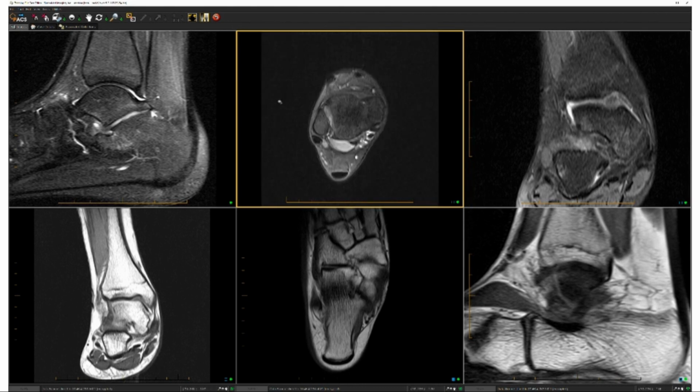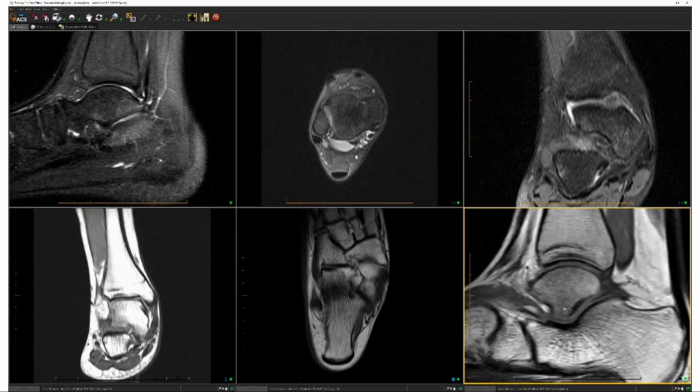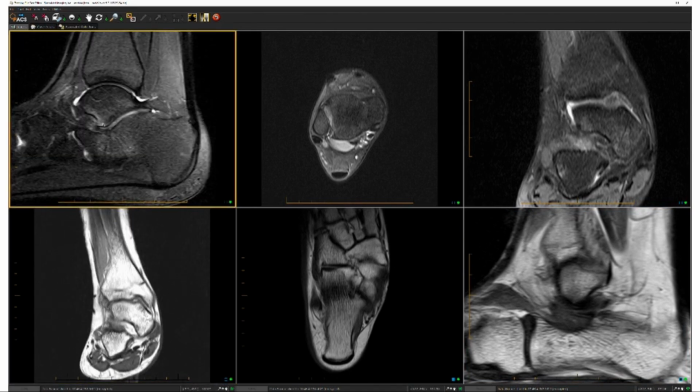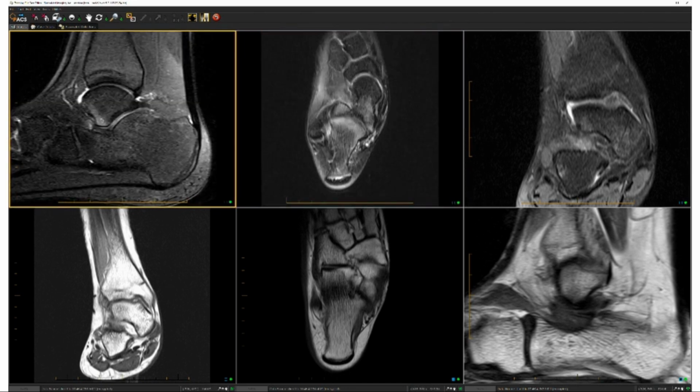So now moving on to my sinus tarsi and my extensor region. I'm going to take a look inside my sinus tarsi, and I notice that I have obliteration of the fat at the dorsal aspect of the sinus tarsi laterally. I also have some minimal edema at the lateral talar process, which I can see here. And that's a finding that can be implicated in lateral hindfoot impingement.